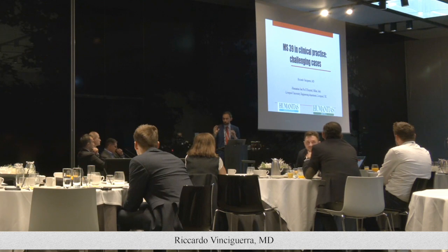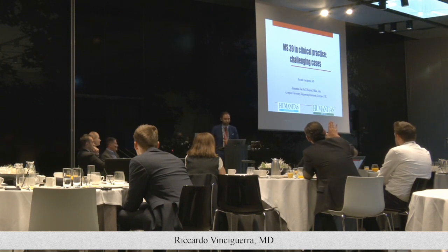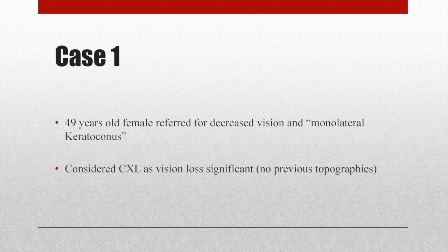So these are not super complex cases, but they are cases in which we show the role of the epithelium. In most of them, you will not see the epithelium at the beginning. So don't ask, because it's going to be at the end. But I have it in all of them, all right? Because I know Danny will say, show me the epithelium. All right, so this is the first case.